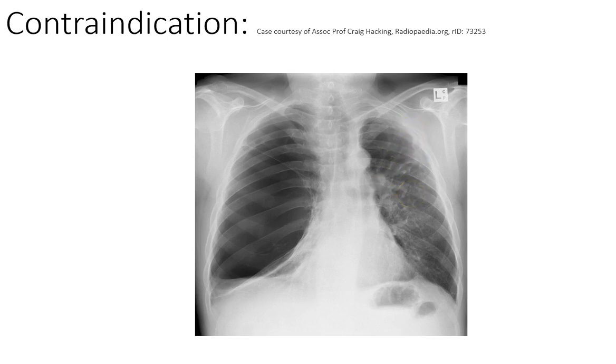So yeah, bullae, we don't use any positive pressure devices because we don't want to cause a pneumothorax. If it was really last-line, do-or-die stuff, then we might, but we would definitely discuss it with the doctors and have them prepared to drain that pneumothorax if we caused one. So it is again a relative contraindication and not something that you should do routinely. Okay, next film.